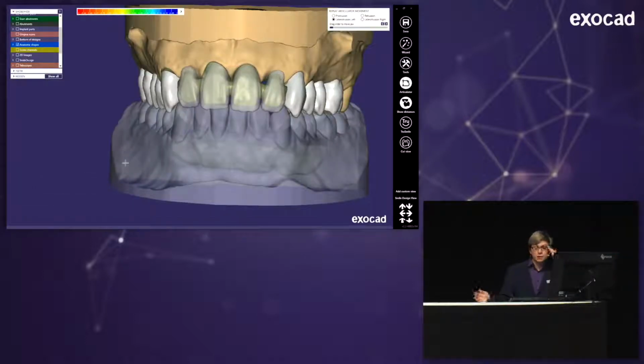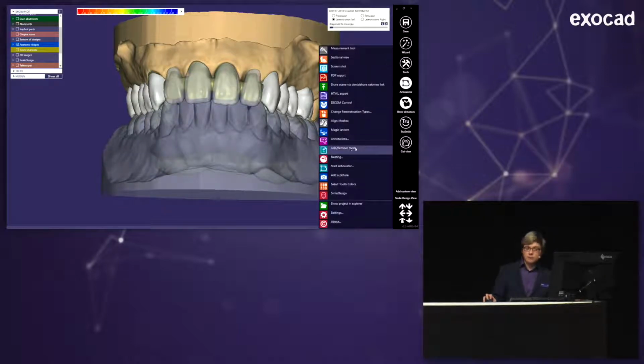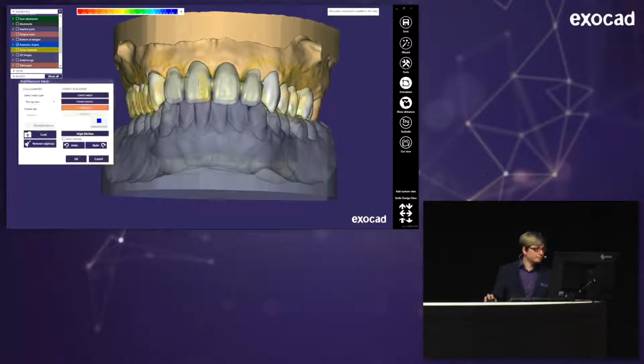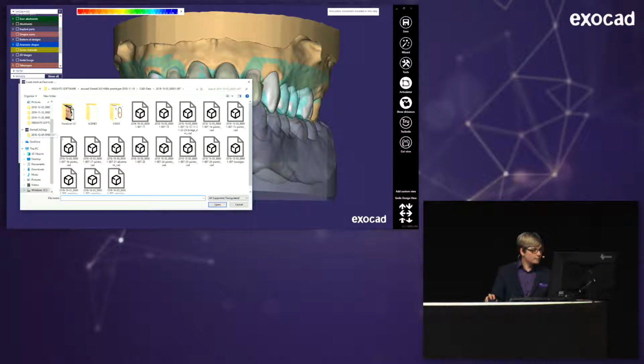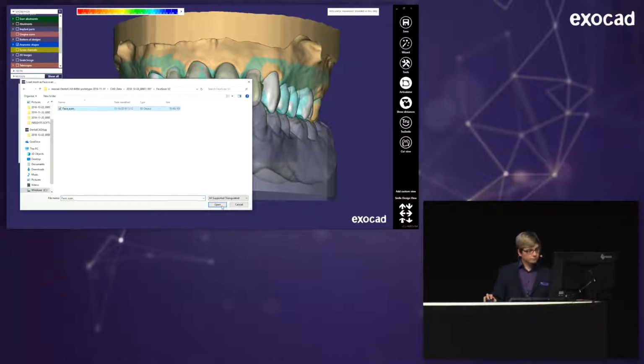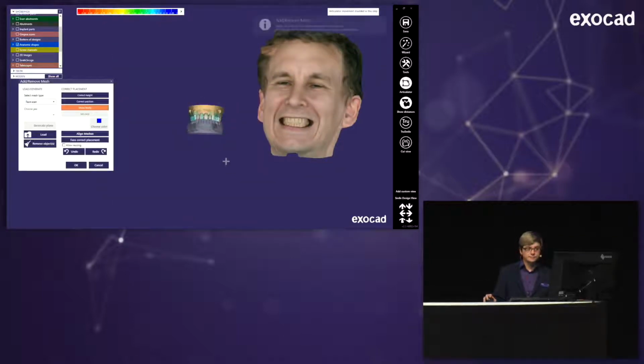What we also can do, what we actually were able to do for a long time now, but we're still improving with every iteration of the software, is use 3D scan files of your face. Whole face scans, because they're getting a bit more popular now. And for this, you just add a mesh like you would a pre-op model or anything else. And we obviously prepared a 3D face scan for that. And here's the option to take a face scan, load it, and here it is.